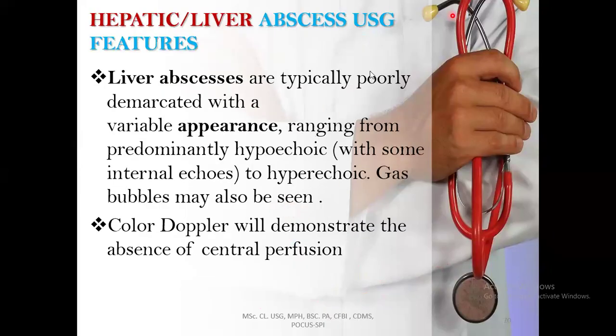So, features of liver abscess. Liver abscesses are typically poorly demarcated with a variable appearance, ranging from predominantly hypoechoic with some internal echoes to hyperechoic.